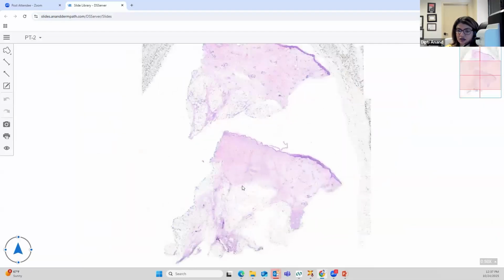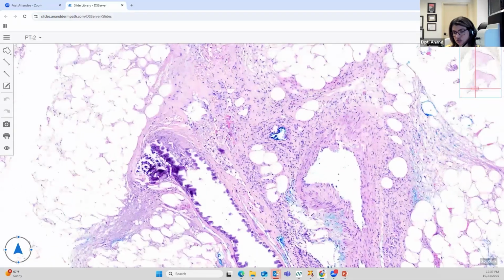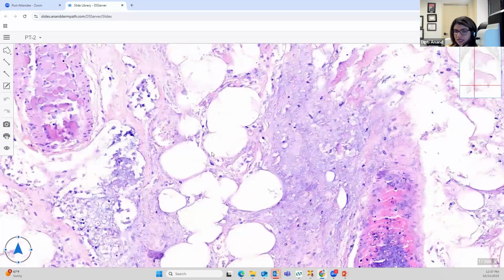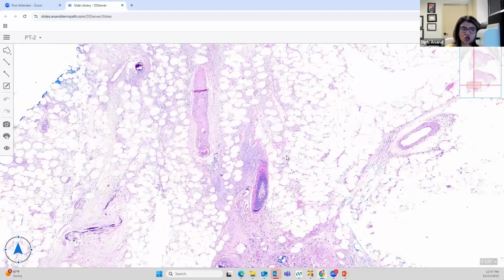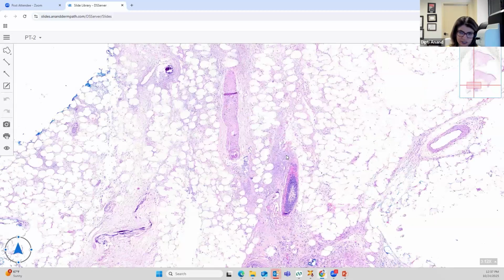However, when you get ischemic necrosis, so calciphylaxis, you can see the nice calcium deposition in the vessels. You can actually also see it in the tissue with this tissue basophilia, and then you see the ischemic fat necrosis. So one thing about understanding the lobular panniculitis: it's very important to actually recognize what different kinds of necrotic fat look like. When fat dies in the lobule, it looks like a specific kind, and that specific kind will tell you what kind of lobular panniculitis it is.